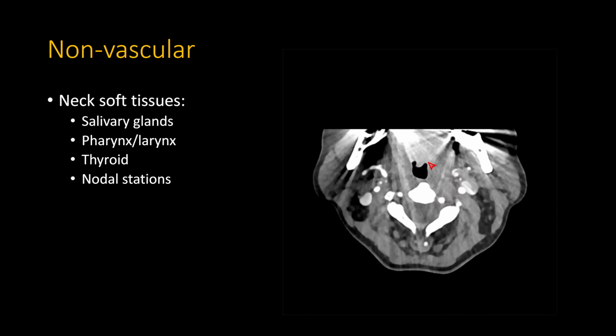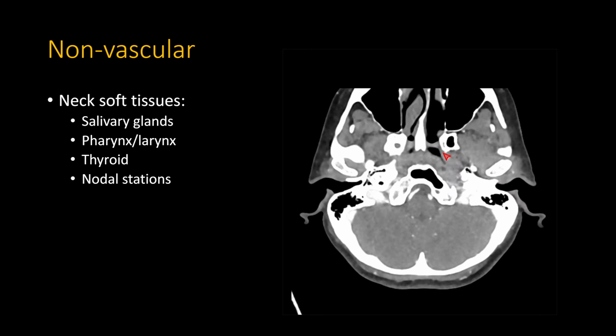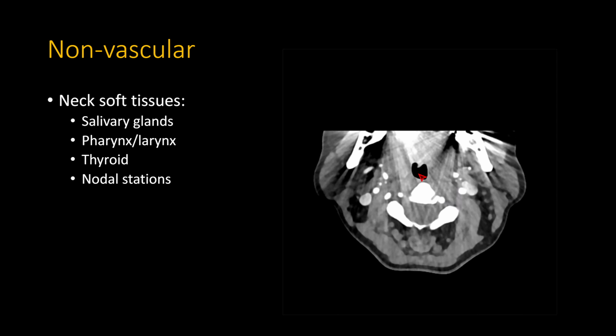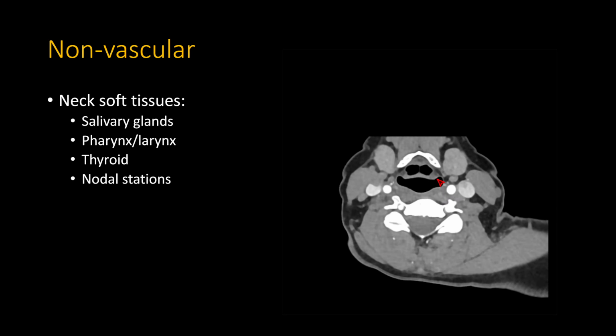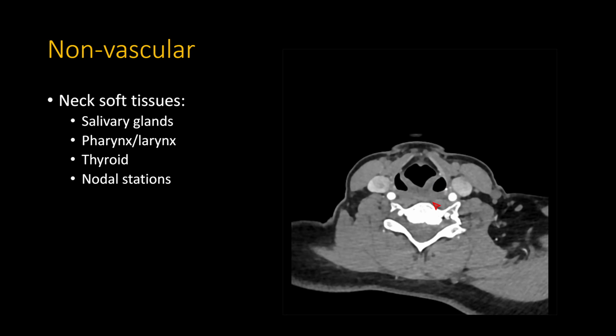And then I look at my pharynx, or the parts that I can see. So here's the nasopharynx, looking for any masses, any asymmetry, something asymmetrically effaced. My oropharynx right here. And once that's done, the hypopharynx here. Your piriform sinuses right here. So look for any asymmetric effacement and things like that. The piriform sinuses right here.